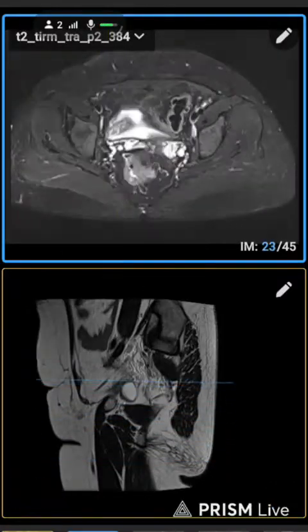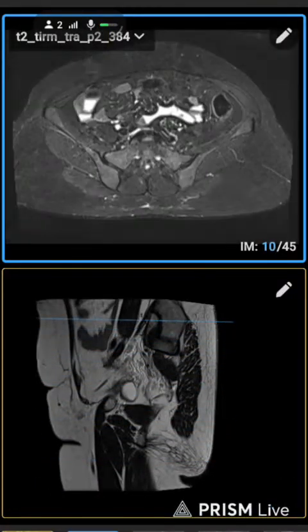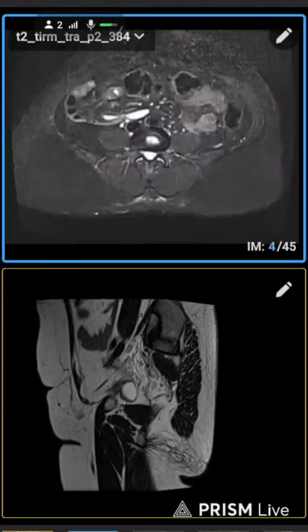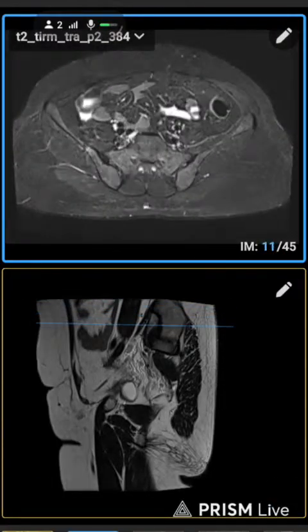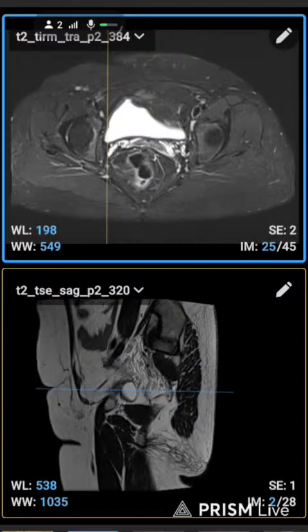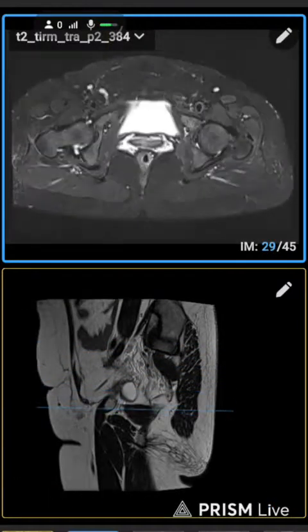If there is any type of abscess, or a bony mass, or lymph node in the pelvic area, it's needed in a rectum scan or prostate.